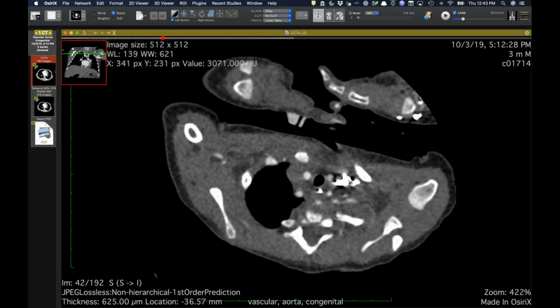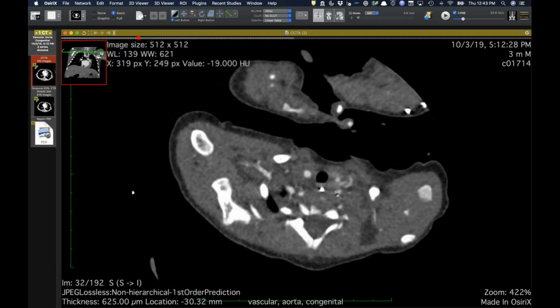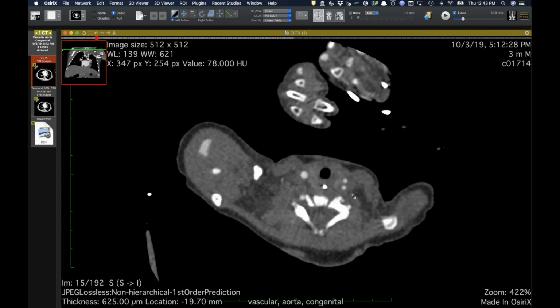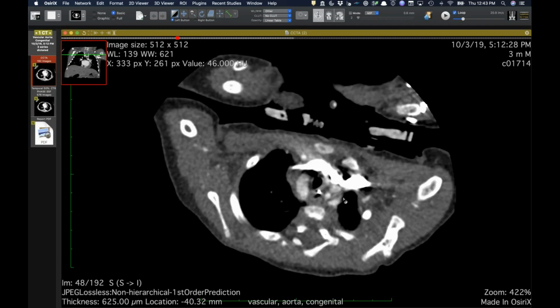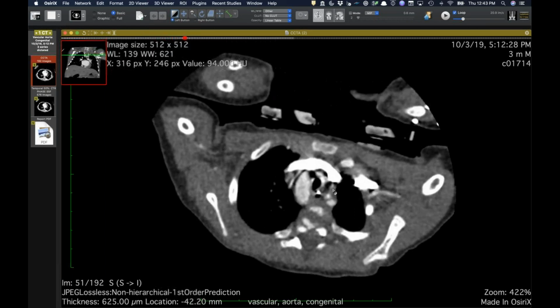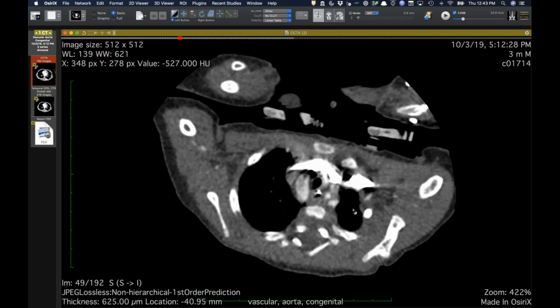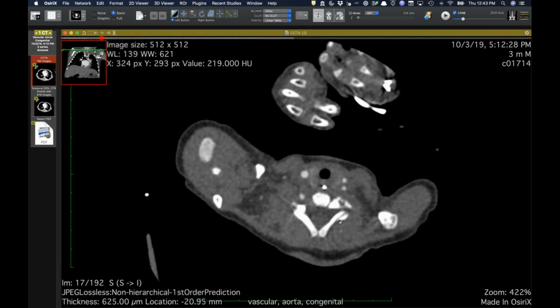And then unfortunately, because of our contrast bolus, we've got streak here. But there's this other vessel coming from anterior that happens to be also headed up in the direction of the carotid. So I think, and this hasn't been confirmed yet because I haven't gone to surgery and they haven't done neck imaging, but it looks to me like there's separate arch origins of the internal and the external carotid arteries on the left, one of which is coming off from the posterior aspect, one of which is coming off the anterior aspect. So it's a vascular ring, whether you call it a double arch with an atretic segment in between here, or whether it's a right arch aberrant vessel. I thought this was a really cool anatomic variant that I hadn't seen before.